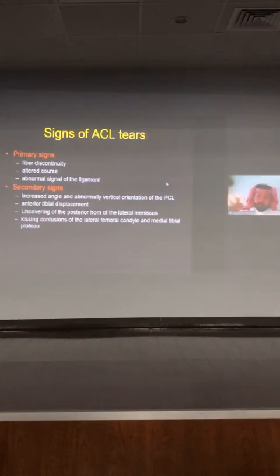If the course of the ACL looks abnormal, if the signal of the ACL itself looks abnormal, I will think about the primary signs. But personally, I don't only rely on just those 3 factors. I also rely on the secondary signs.